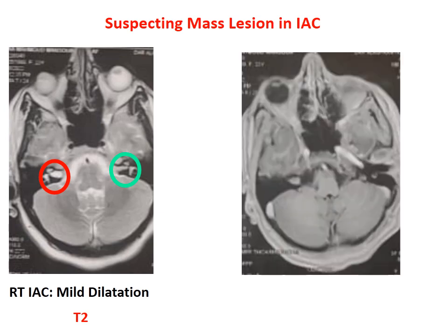You look for the T1 with gadolinium. Why do we say that this is T1 with gadolinium? We say T1 because the eye globe is black, because the CSF in the ventricle is black. Why do we say gadolinium? Because the sigmoid sinus is hyperintense here, so there is enhancement of the blood. What do you notice in this picture? You can see that on the left side, on the normal side, there is no enhancing lesion, whereas on the right side, there is an internal auditory canal lesion which is enhancing, and it should be, as we know, in T1 there should be no cochlear nerve, no nerves that can be seen. So if you see this lesion, this is an enhancing lesion, and this is an intracanalicular lesion.